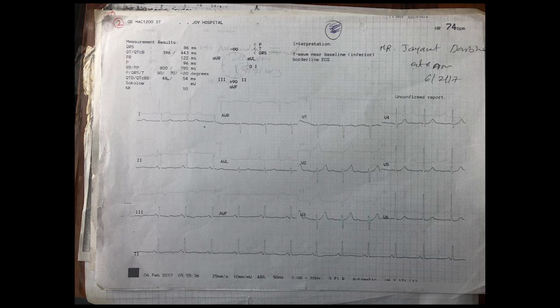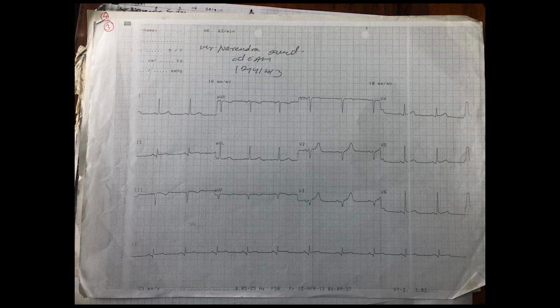Okay, thanks. Calculation of QRS axis in image 3. Observe 6 leads. Lead 1 predominantly positive, lead 2 predominantly positive but has negativity, lead 3 predominantly negative, lead AVR predominantly negative, lead AVL predominantly positive, lead AVF predominantly negative. Actually, there is no equivocal lead in this, but if you carefully observe, lead 2 is closest to equivocal out of these 6. So consider lead 2 equivocal.